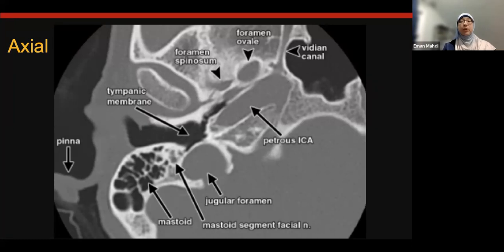And usually you should have an approach. You would either start from the external and go to the inner ear structures, or you start from the inner ear structures going all the way to the external. This way, you don't miss any of the structures that you need to check when you read a temporal bone CT. The way I would use and the way I was taught is starting from the external.